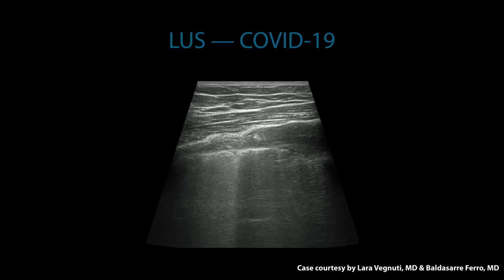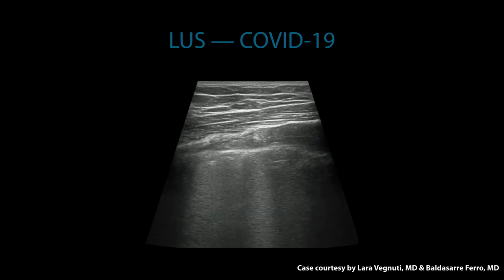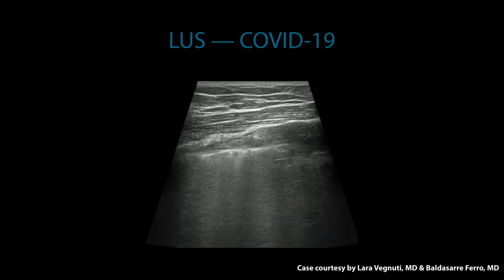The same we can appreciate in the next image. We have a thickened pleura. You have the feeling that lung sliding is reduced, and also these vertical artifacts can be seen, and additionally, some really small consolidation areas. But where can lung ultrasound be used in the setting of COVID-19 infection? Well, one of the major problems with the infection and pneumonia is that we see vascular leakage. We see fluid moving into the lungs, and that's also why we have these B lines.